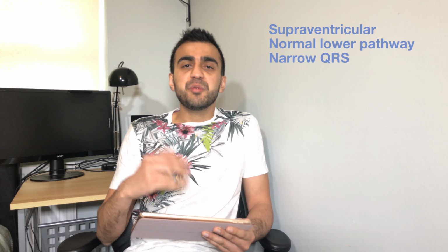So, in a supraventricular problem, there is a problem at the top of the heart. But if the conduction actually makes its way down the AV node, the lower part of the conduction cycle actually works normally. So if the lower part of the conduction cycle works normally, then we expect to see normal QRS complexes. So in a supraventricular problem, the QRS complexes are normal. Unless, obviously, there's exceptions to the rule, especially if you've got a problem with the lower part of the conduction, like a branch block or something like this, then you're going to have a problem with the lower part as well. But typically speaking, in a supraventricular problem, we should see normal QRS complex.